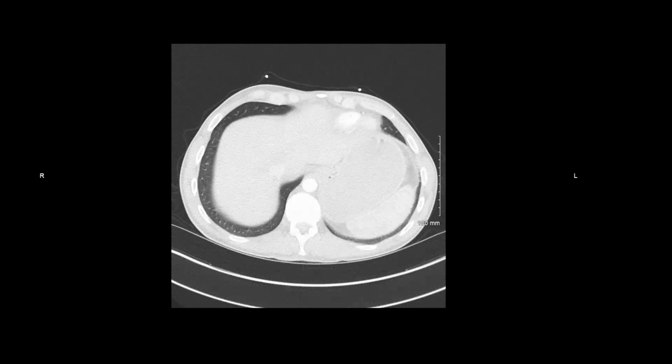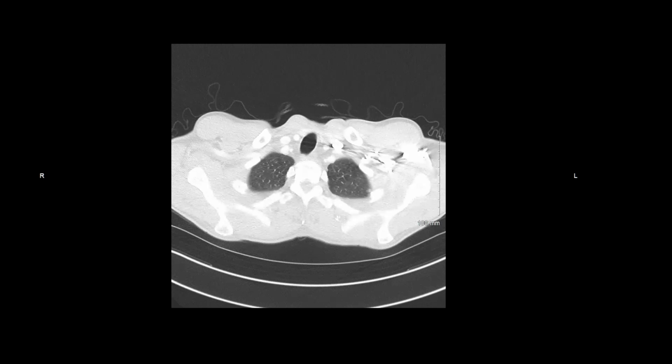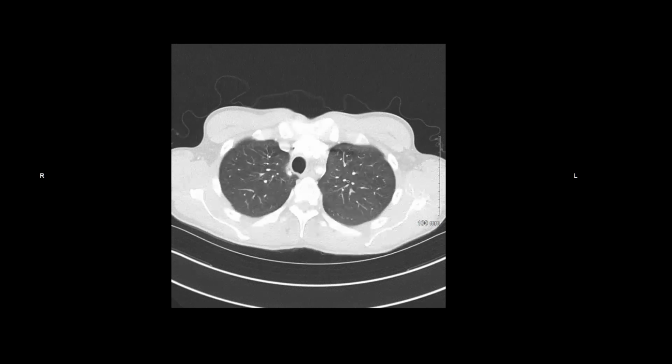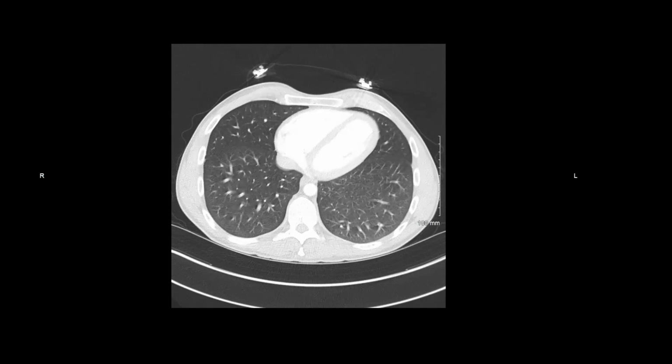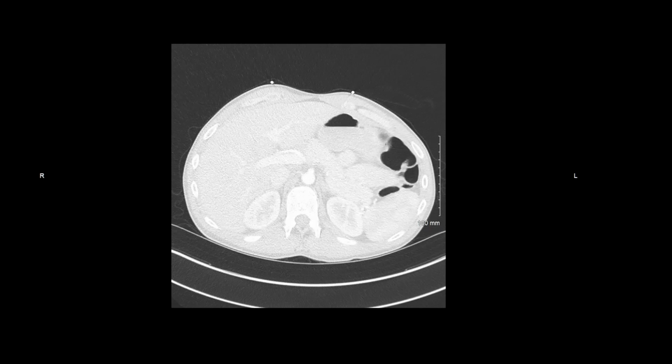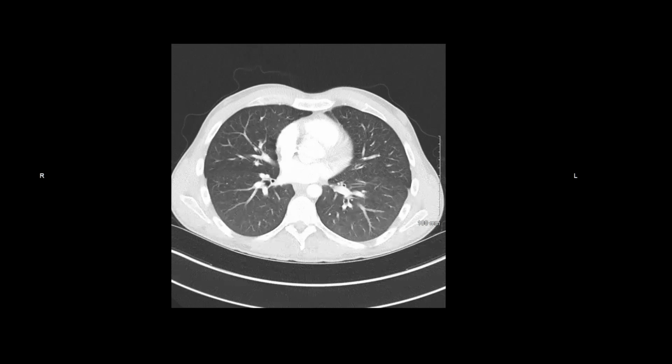And seeing none, I will then proceed to the right lung. Again, I'll start at the right apex. I'll move inferiorly, focusing on the anterior portion of the right hemithorax, all the way down into the right middle lobe. Then I'll turn my attention to the posterior right hemithorax, again, looking for any abnormalities within the lung.